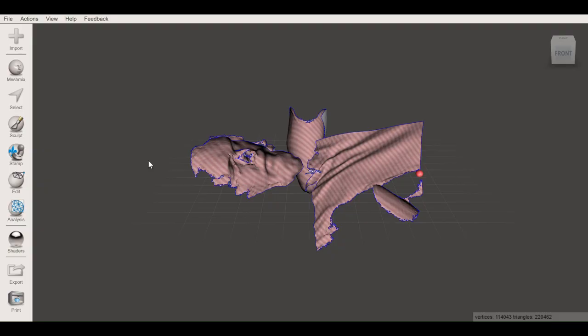In this particular course module we are going to go through how to clean up a 3D scan of the inside of a test socket where we have previously spray painted that socket matte black. My name is Joe Fairley, I'm the owner of Ascent Fabrication, and let's get into it.